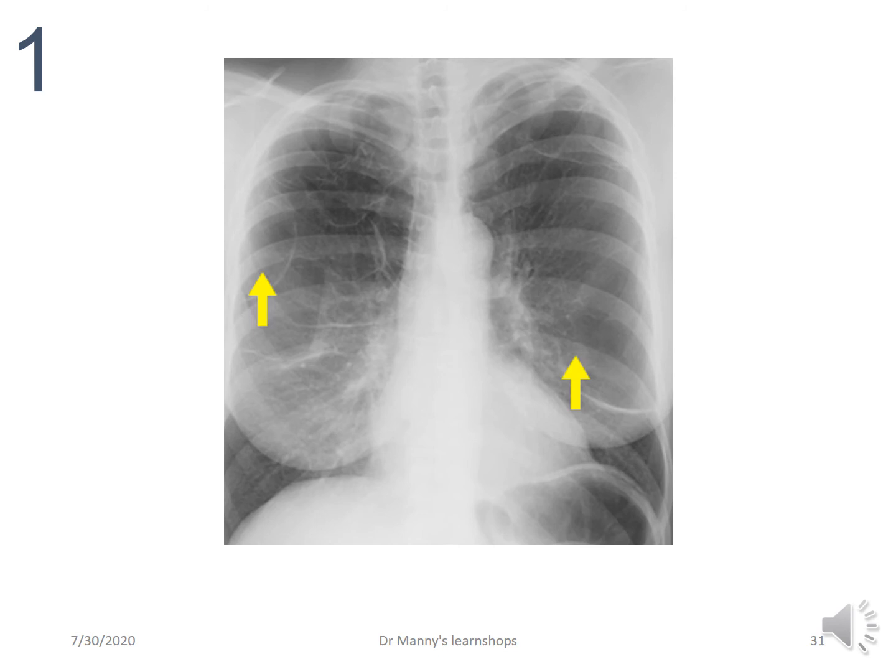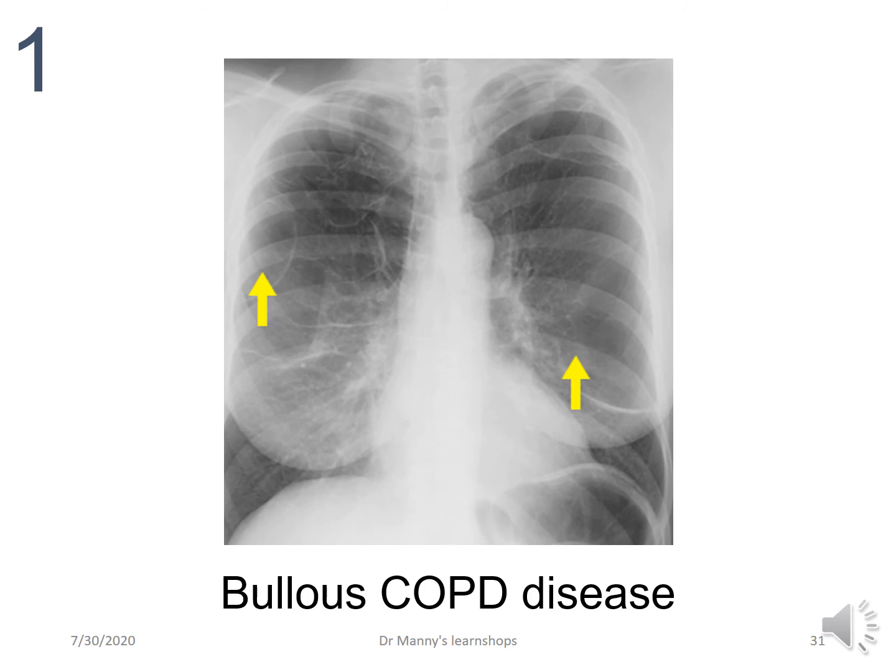Right, have a look at this chest x-ray. You've got big lungs, horizontal ribs, widely spaced intercostal spaces, and yes, obviously this is a female because you've got increased whiteness in both middle lobes and lower lobes as a consequence of increased breast tissue. So this is chronic obstructive pulmonary disease, and what you can see are decreased vascular markings as a result of bullous disease, or bullae bilaterally.